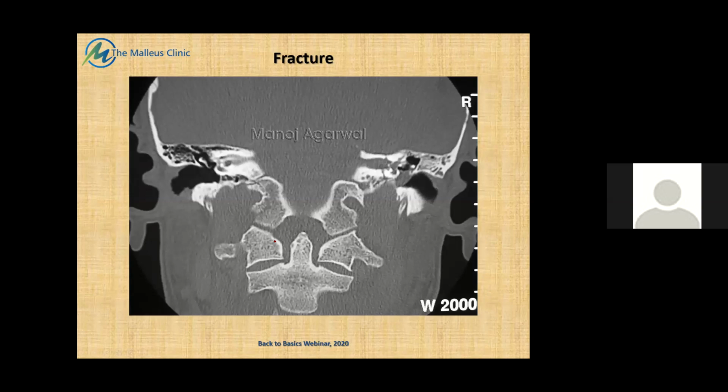This is another patient, a different patient. Coronal view, the right side, at least in this view, appears normal. On the left side, you can see some fracture lines here as well. But more importantly, what we are concerned with is this fracture line here and here, that is above and below the internal auditory canal on the left side, along with some fracture fragments here as well. And associated with that is this isodense shadow in the tympanic cavity, which indicates a hemotympanum. So this patient too is liable to complaining of vertiginous attacks following the trauma.